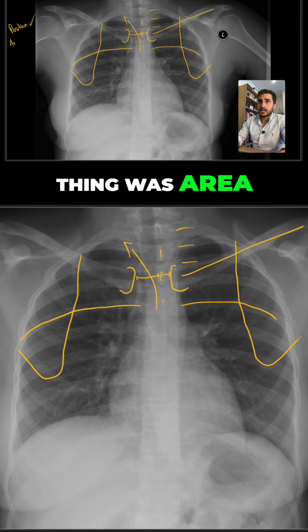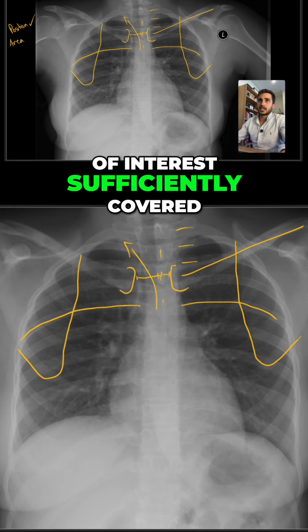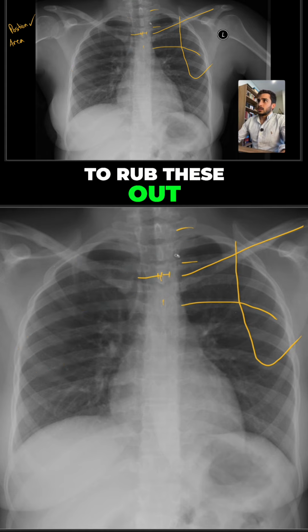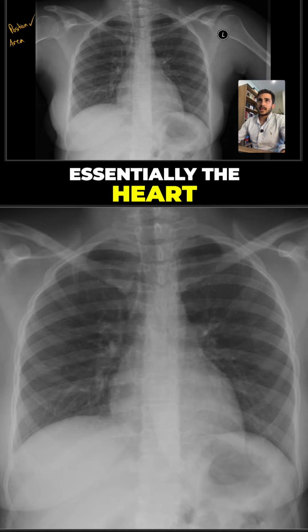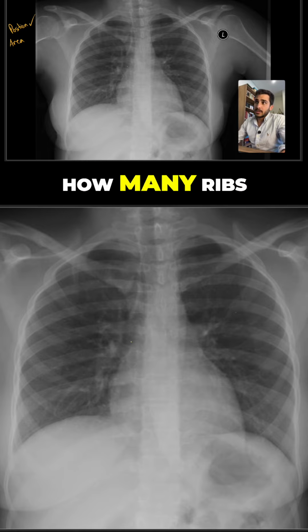The next thing was area. Okay, is the area or the region of interest sufficiently covered? So I'm just going to rub these out. Area, we're talking about the lungs, we're talking about essentially the heart, and potentially how many ribs we can see.